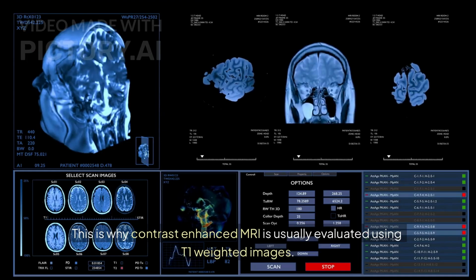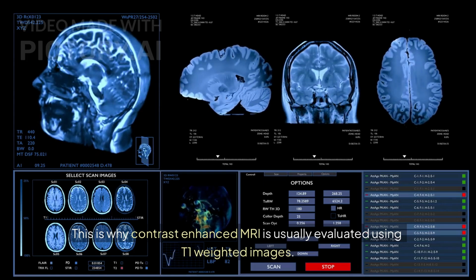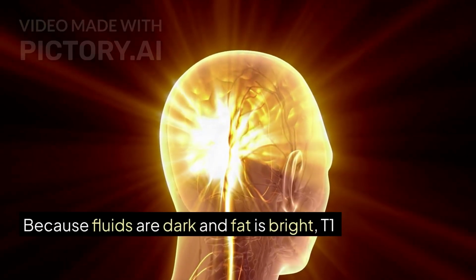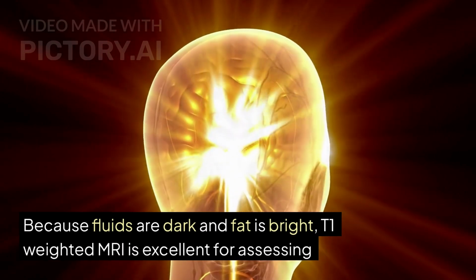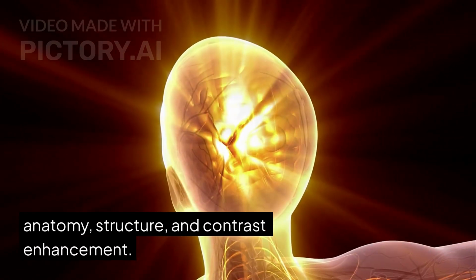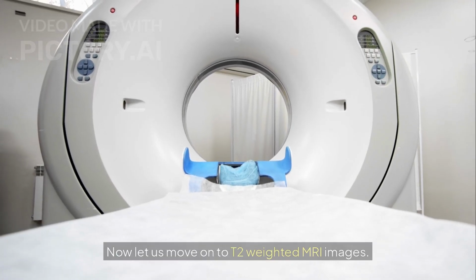This is why contrast-enhanced MRI is usually evaluated using T1 weighted images. Because fluids are dark and fat is bright, T1 weighted MRI is excellent for assessing anatomy, structure, and contrast enhancement. Now let us move on to T2 weighted MRI images.